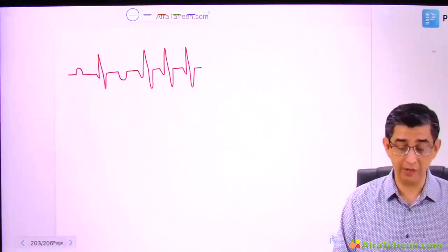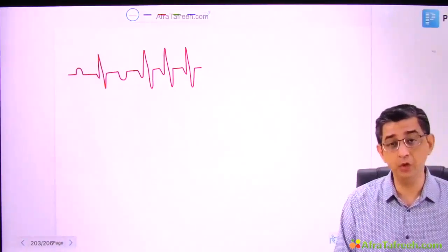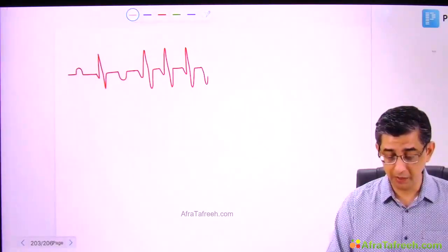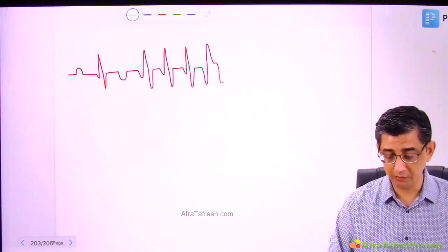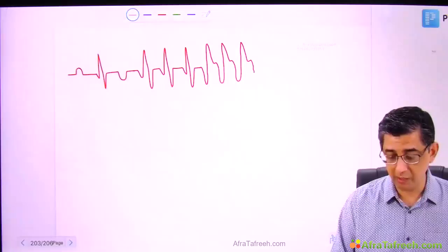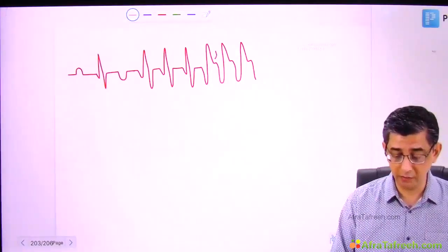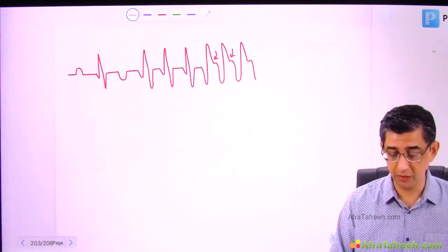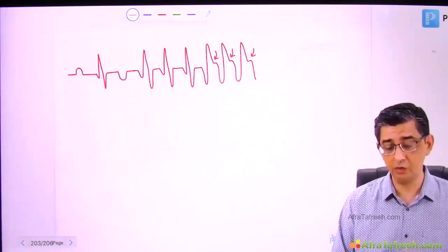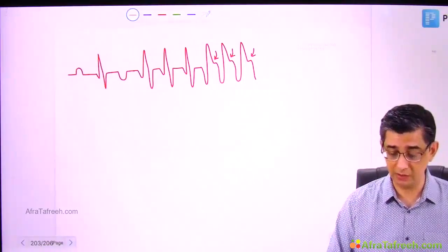Majority of the questions will give you broad QRS complexes, or they might use the words premature ventricular contractions. Now, as the arrhythmia picks up speed, in some of the recordings given to you in the exam, or that I'm hand drawing before you, you will notice that in the downswing of the S wave, anything that goes up is R, anything that comes down is S, there might be a notch present. This notch is what is called the Josephson sign.